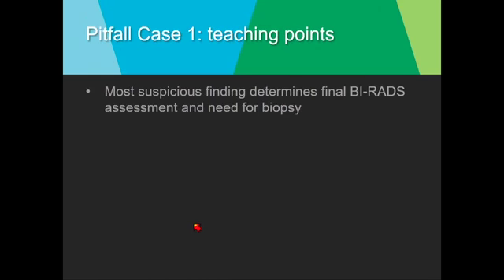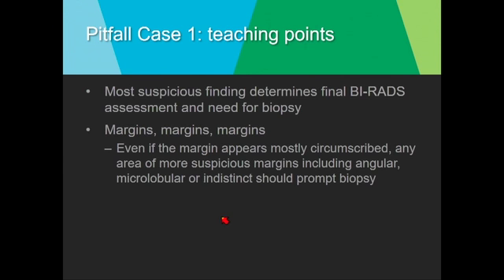It's important to remember that the most suspicious finding that you see, either by ultrasound or mammography, is going to determine your final BI-RADS assessment and the need for biopsy. Often, as I hope you'll see in the next several cases, the key is in the margins. So carefully evaluate the margins.